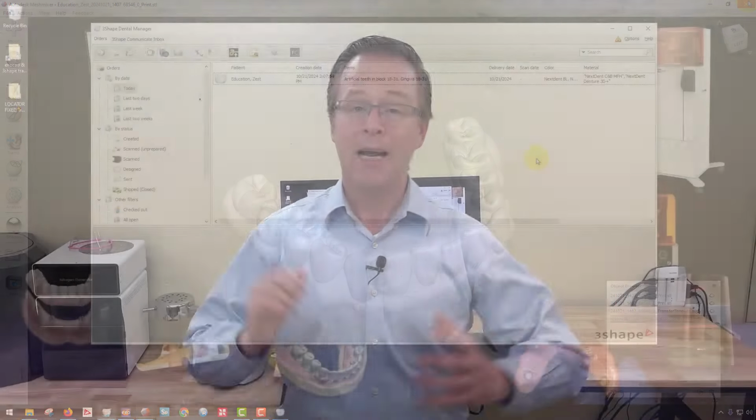I hope this training video has been helpful for you, because now with the 3Shape basic design software, I've made a separate printable or millable tooth arch and denture base arch utilizing the dental system software. I can bring that over to my 3D printers, I can take it to my milling machine, or I can simply go ahead and send this to a dental laboratory.